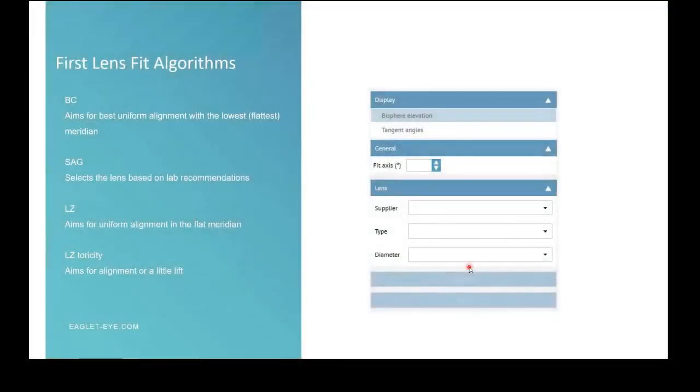So I'm going to jump in here, and I'm going to thank Rainier for this level of detail. We've gone back to the basics of the software and the instrument to build up to the first fit algorithm. So I guess what I'm trying to say is you don't need to worry about this level of detail for the average usage of an ESP. It's more for learning, and obviously there are going to be situations where you have to dig in a little deeper, but you don't need to go into this level of detail for most fits. Is that fair, Rainier?